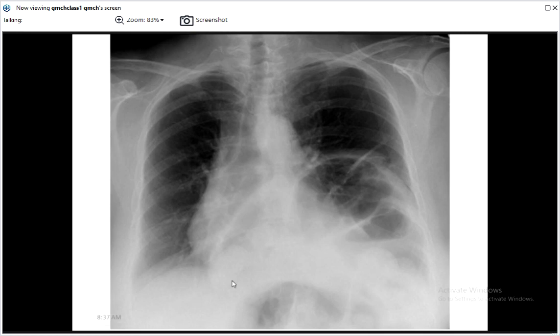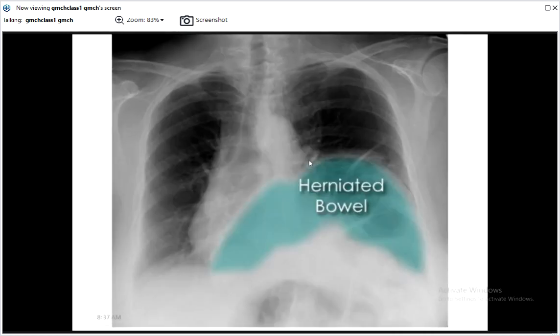Okay. So another diaphragmatic abnormality, apart from these angles and the left and right difference, that you can see on this X-ray. Where is the left diaphragm? It's so high. And what are these? You can see the air-filled spaces. So this is the diaphragm and this is a herniated bowel. It could be a case of CDH, congenital diaphragmatic hernia. So the diaphragm has gone too high.